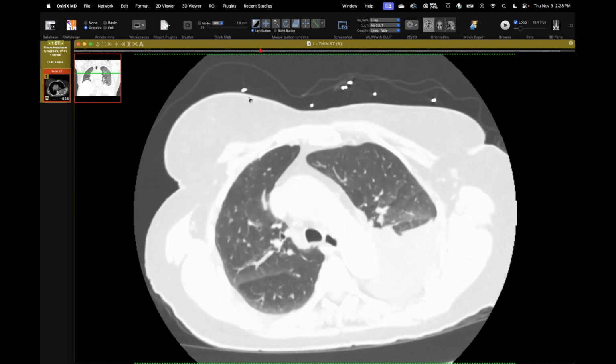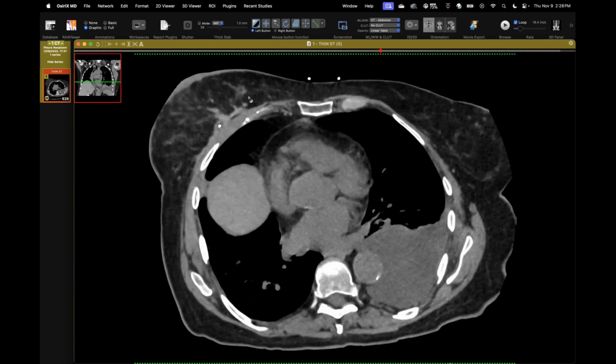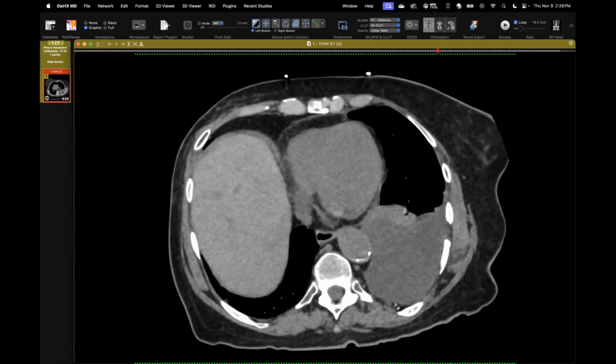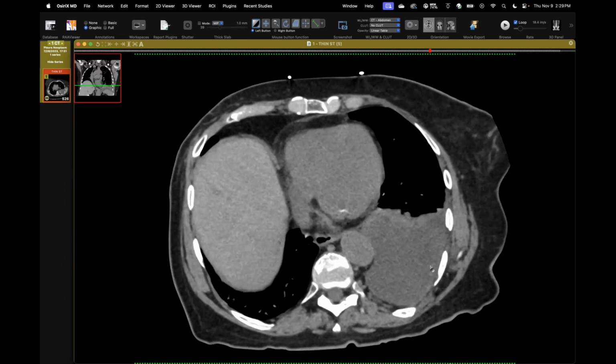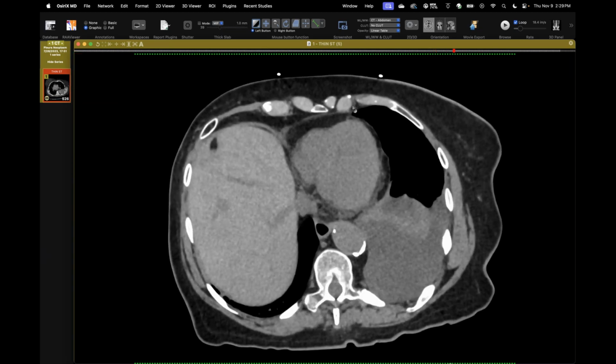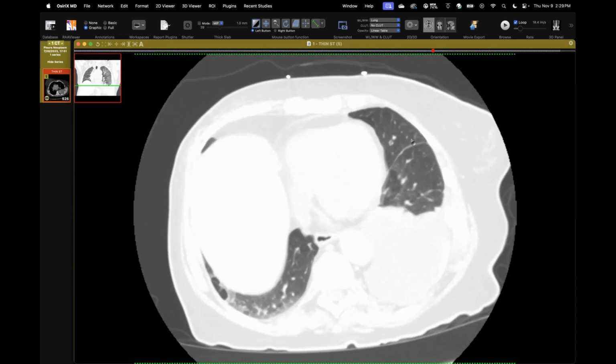So they evaluated this pleural effusion, and lo and behold, and this is something they can do now with some new staining, this is a mesothelioma, and it's kind of an odd one. I've seen a few present as these loculated effusions, but usually they have a pleural rind or some soft tissue component. Now this is non-contrast, but usually you still can make out the tissue, and you see the thickening along the fissures. Even this fissure here is just minimally thickened at most.